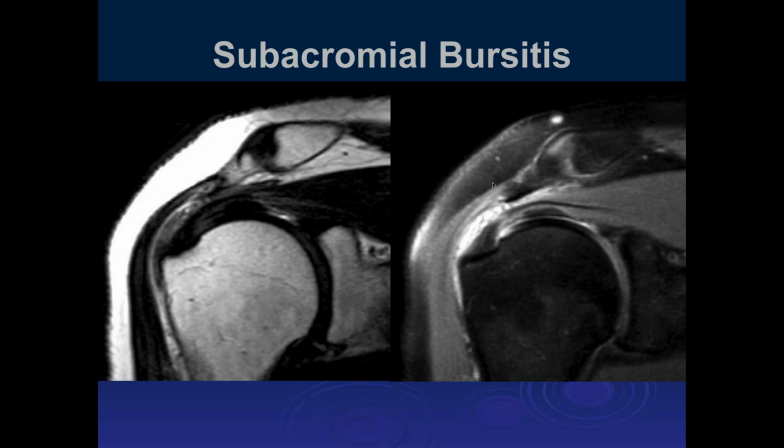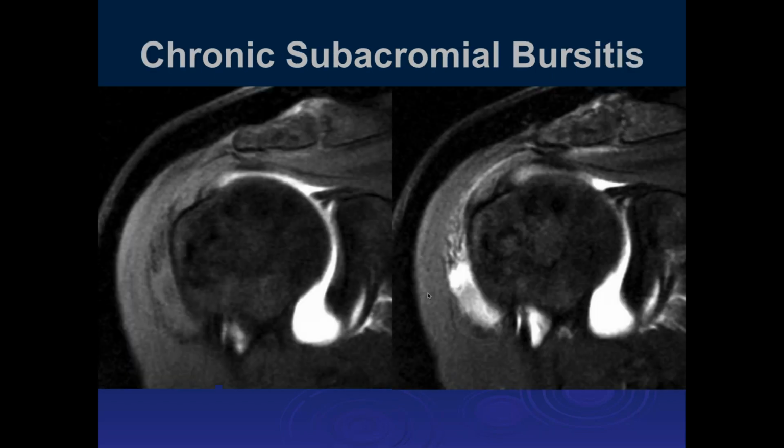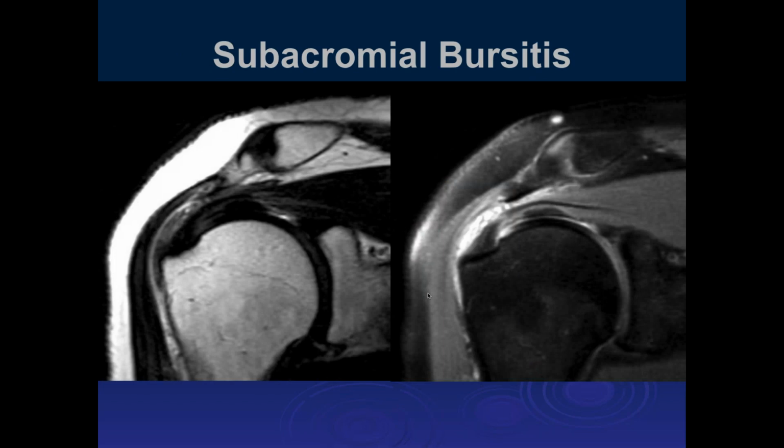And this is just another example of a little bit of lateral downsloping, eburnation, and the secondary irritation of the bursal side surface. But in the late 1980s and early 1990s, what was found, in pathologic studies, is that the bulk of tears and partial tears really tend to primarily form from the joint side surface rather than the bursal side surface.